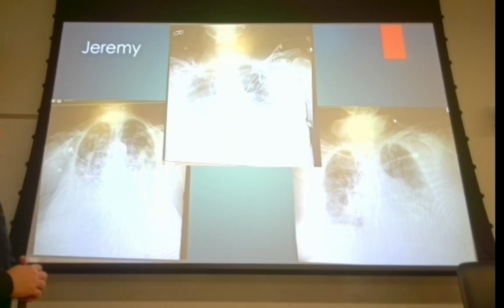We don't really see a whole lot of rotation. Really not much, if any, at all. The clavicles are about where they need to be. So how could we identify if that was truly a bilateral pleural effusion, or if we've got something else going on?